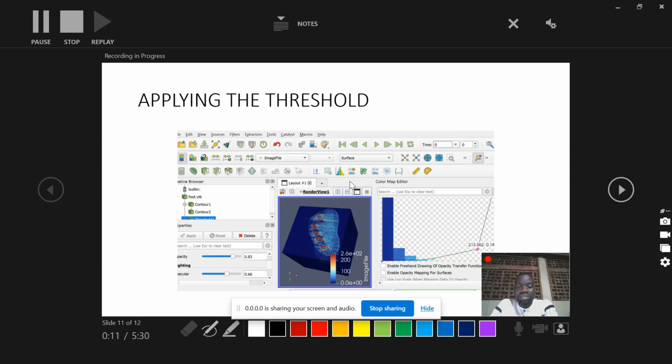So here I'm determining the pressure when a person is moving, so I can study where pressure is more exerted. When a person is moving, at the bottom usually, I can study the density, where pressure is more concentrated.